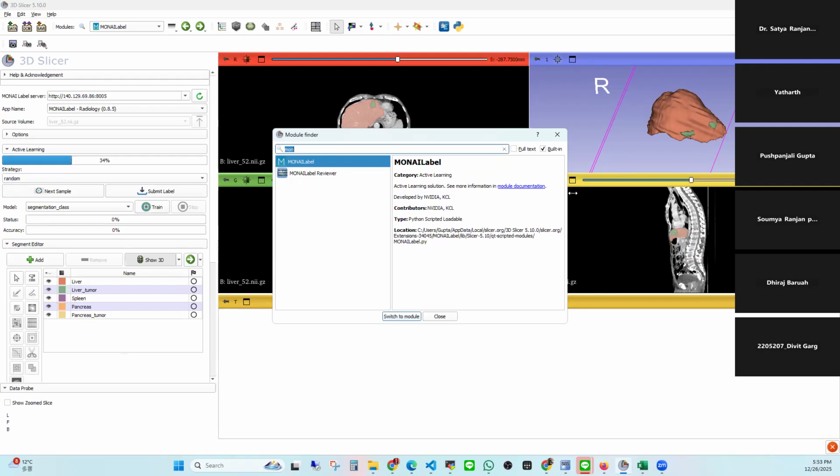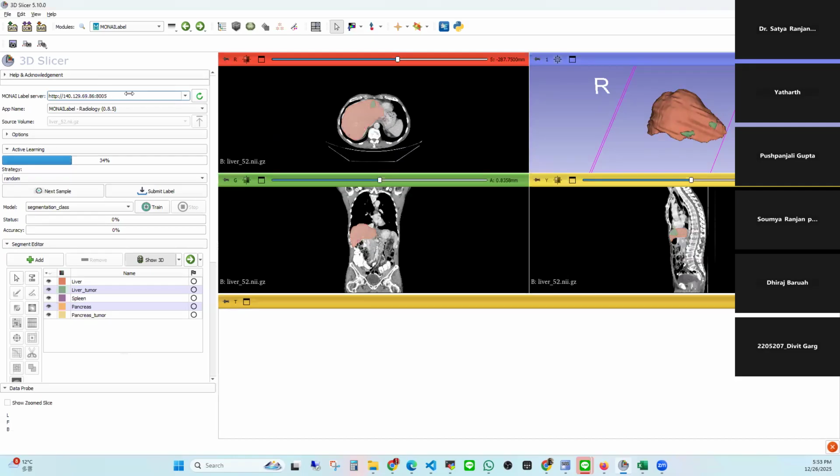Yes, ma'am. Then I'll send this server address in our chat. Connect to the server. If you don't connect to the server, you cannot use these things. Okay, ma'am. Just use that IP and connect to the server.